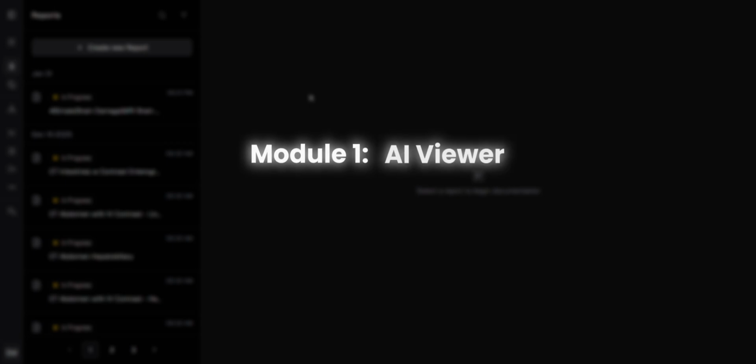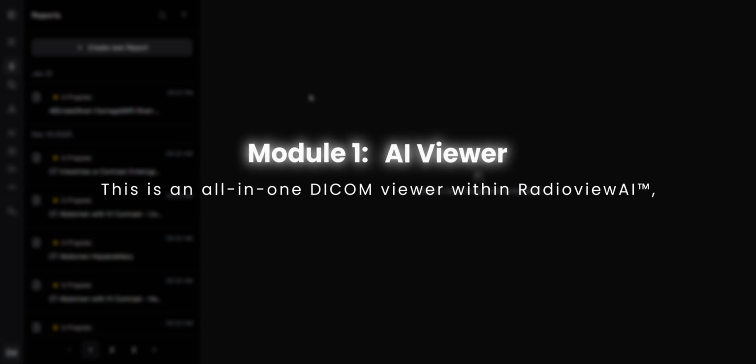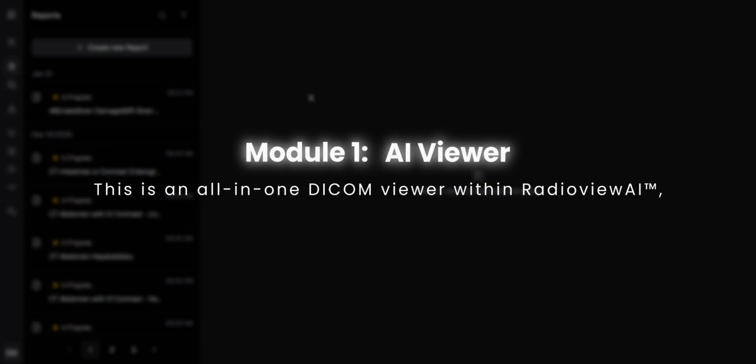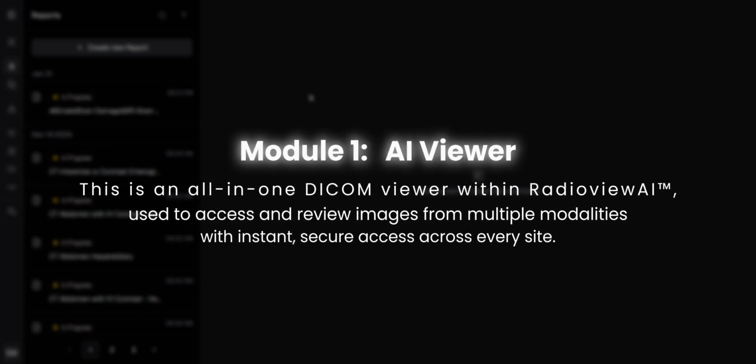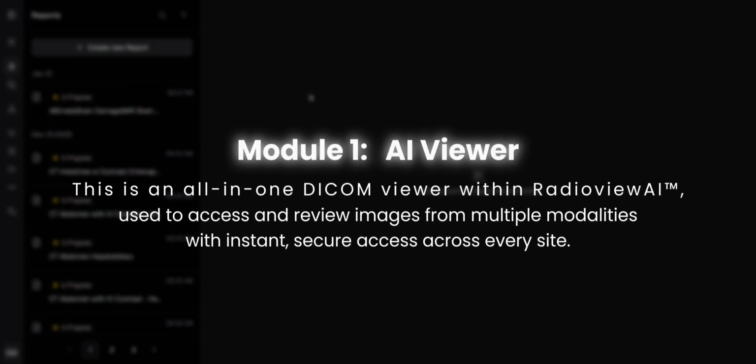Module 1, AI Viewer. This is an all-in-one DICOM viewer within RadioView.AI used to access and review images from multiple modalities with instant, secure access across every site.